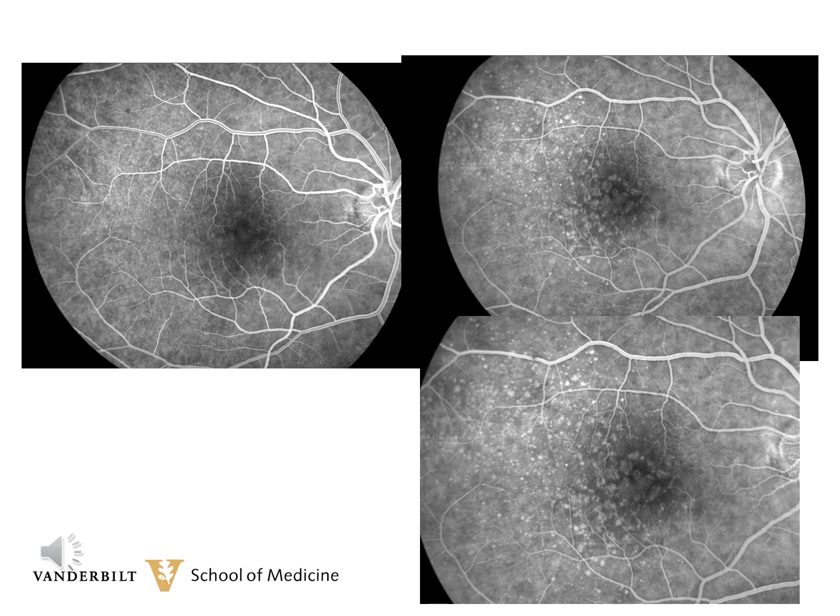There's a variable pattern of fluorescence on the angiogram because some drusen seem to be hydrophobic and therefore block the dye, and some hydrophilic and it will attract and therefore absorb the fluorescein dye. Note on the angiogram, the hyperfluorescence of the drusen does not change in size, however, throughout the angiogram. The larger drusen near the fovea partially block dye early and they stain late.